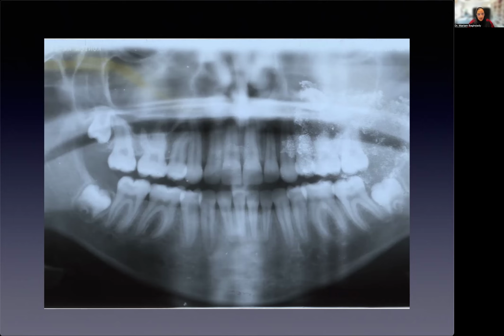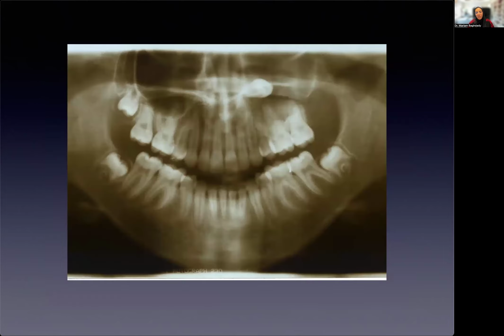Patient, 6 months later, ended up in the emergency room because of severe, severe sinus pain. This is a young patient, younger than 17 because the third molars are not there. But anyway, ended up in the emergency room, major sinus problem. And they took a panoramic radiograph in the emergency room because they wanted to see if it was odontogenic. And basically what they saw is this tooth over here that had been pushed upwards. There's loss of the floor of the maxillary sinus, loss of the lateral wall of the maxillary sinus, the posterolateral wall of the maxillary sinus.